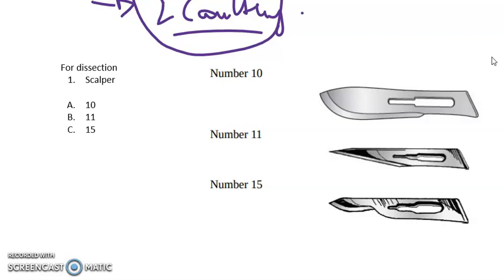So a scalpel, actually we should have letter L over there. Let me just correct that for you. One second. Let's correct this real quick. Okay, we have it. So this is going to be a scalpel. There's a difference between a scalpel and a scalpel. Alright.